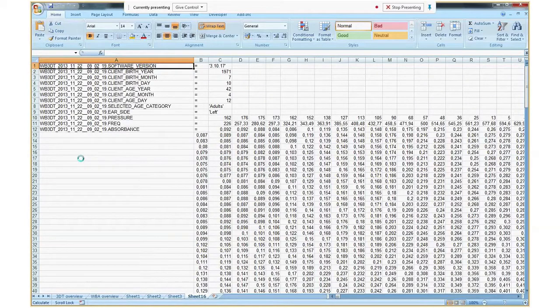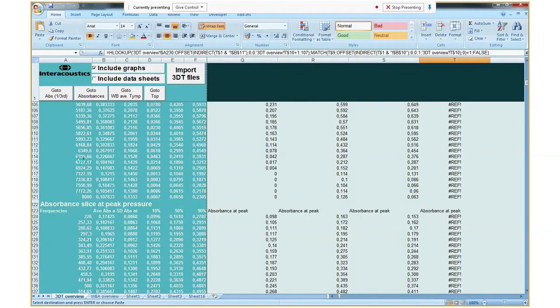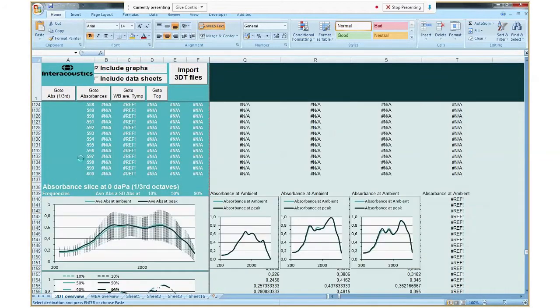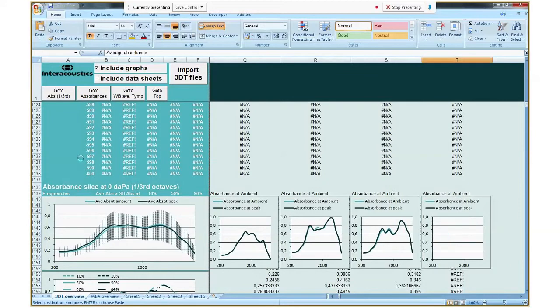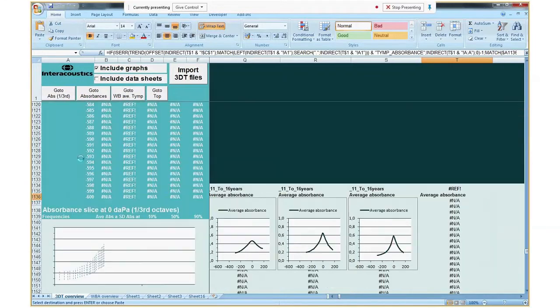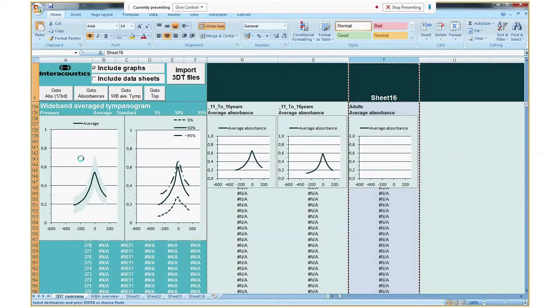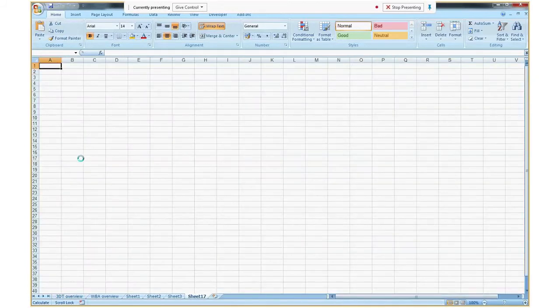Below that graph there is another graph that we didn't see yet, but that one is showing the percentiles. So instead of using standard deviation, you can then choose if you want to use, for example, the 10th percentile, the 50th percentile, and the 90th percentile. You can change which percentile you want to see. You can make it from 5 to 95 or what you want.